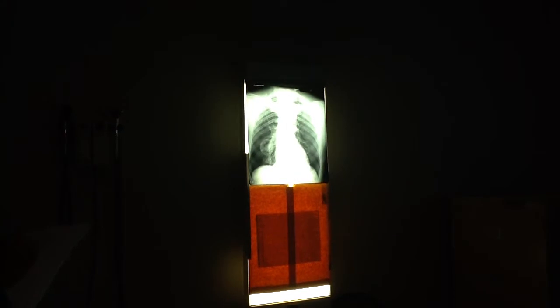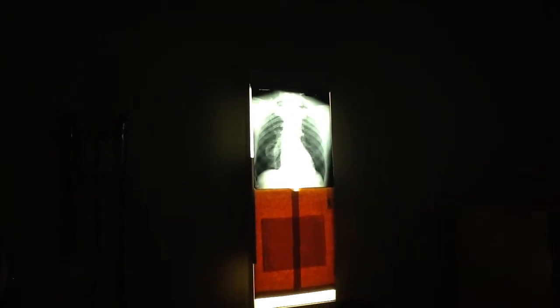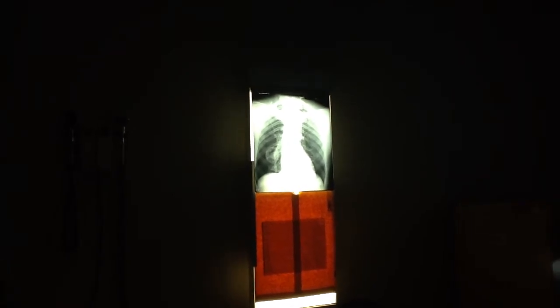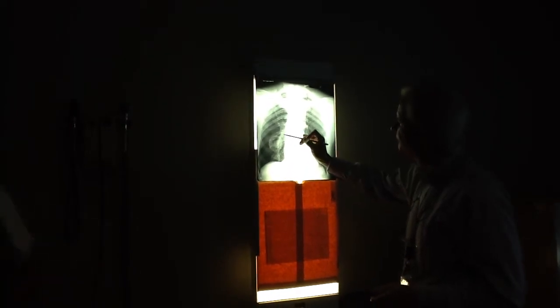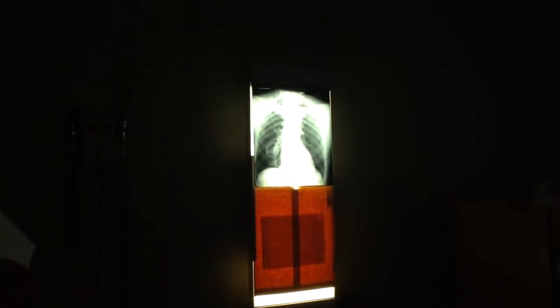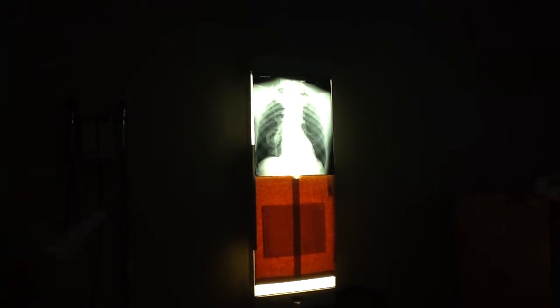And there's no way to know for sure where it is without a lateral, because there's no silhouetting that we can use to know where it is. Looks like we can kind of see the vasculature through it, doesn't it? Yeah, it does. So that may put it a little bit more anterior. Is the density circular or oval? Circular. Does it have a well-defined outer border?